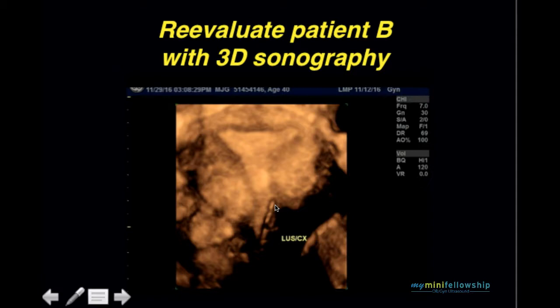So again, I'm not saying that ultrasound would not be the first line of imaging in IUD evaluation. It did a good job even back before we had real-time ultrasound. It does a good job. I'm not trying to deny that.